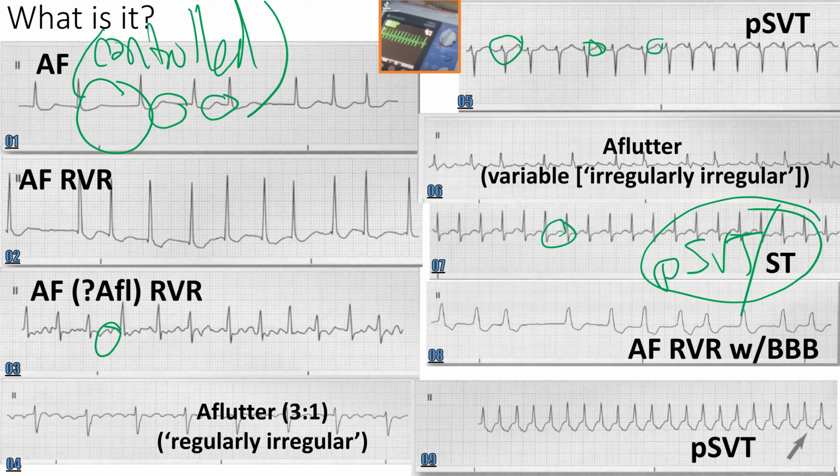Okay, so this patient, if they had a low blood pressure, less than 90, we would skip non-pharmacologicals. Like, wait, I'm going to do carotid massage? No, their blood pressure is way too low. You've already skipped all those pieces. Now you can't give medications either because the medication will lower the blood pressure. The next step is what? Electrical shock of some sort, right? So we have to shock them. They probably have a pulse here, and if we're going to shock them with a pulse, what's the button we have to press on the machine? It's synchronized. So it's synchronized cardioversion.